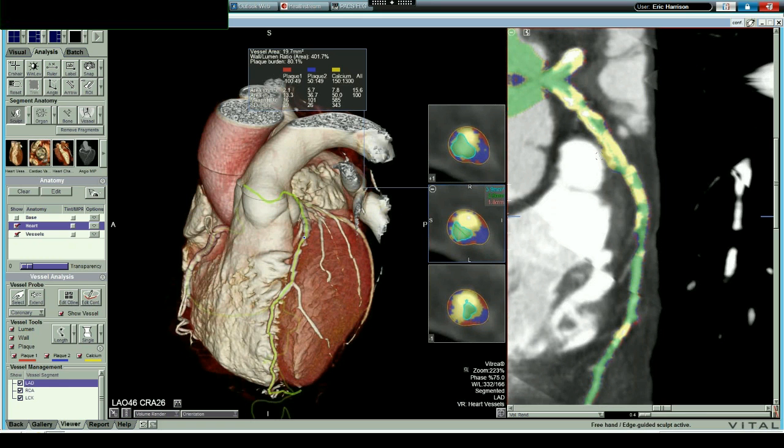The problem with the red is there's epicardial adipose tissue called EAT, E-A-T, that's surrounding the coronary arteries. The coronary arteries are embedded in that, and so that puts it on the outside, this red line. And so then we got to find red that's actually on the inside, and so we got to theorize where the wall is of the coronary to find where that's inside.